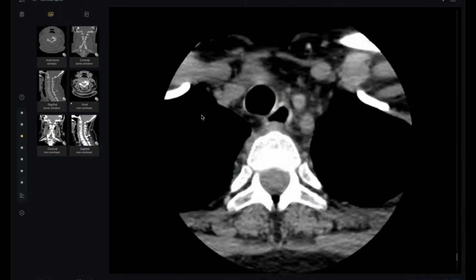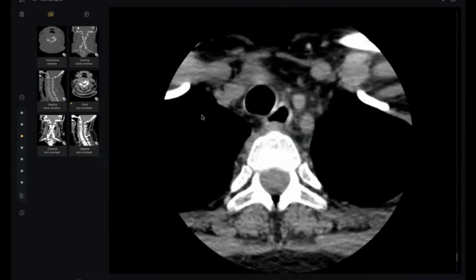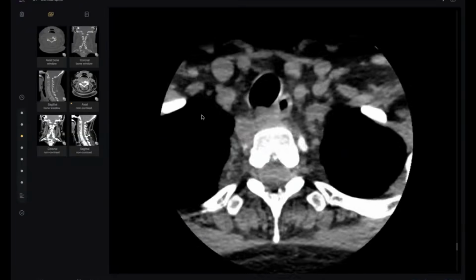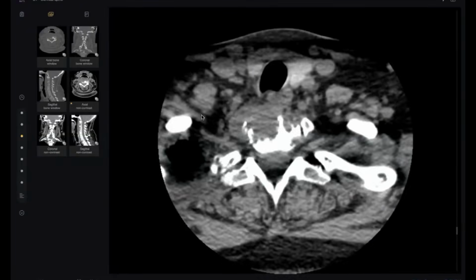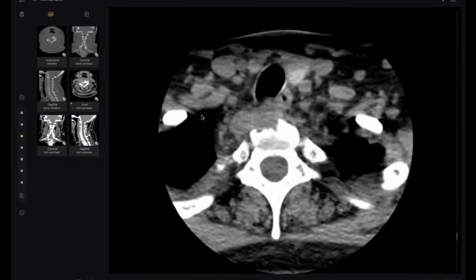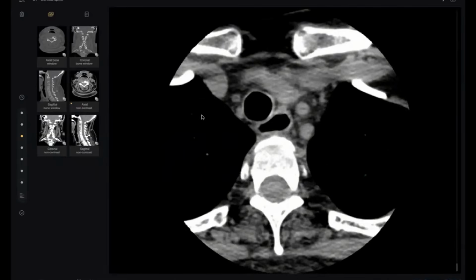And the mediastinum. Doctor, what's your diagnosis? So likely an infectious etiology, possibly TB. Do you have any clue here in this cervical CT that can prove this is TB or not? Uh, the subligamentous spread of infection. What else?